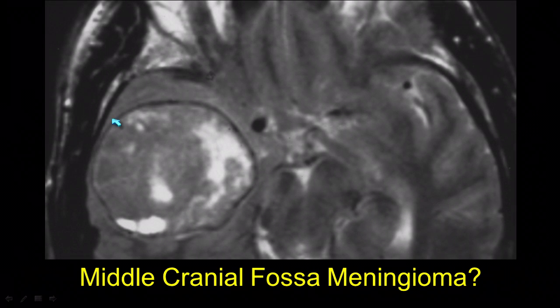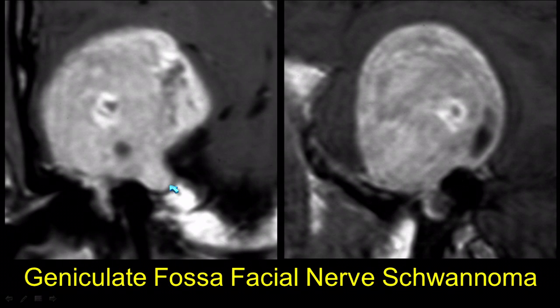Here's a larger lesion. This case was thought to be a meningioma. Looks like an extra-axial mass. It's benignly compressing and displacing the brain. Looks like it has a good CSF vascular cleft between the lesion and the brain itself. But what they didn't notice was this is actually arising from the geniculate ganglion down here inferiorly. And you can see the swirling Antoni A and B fibers within the lesion.